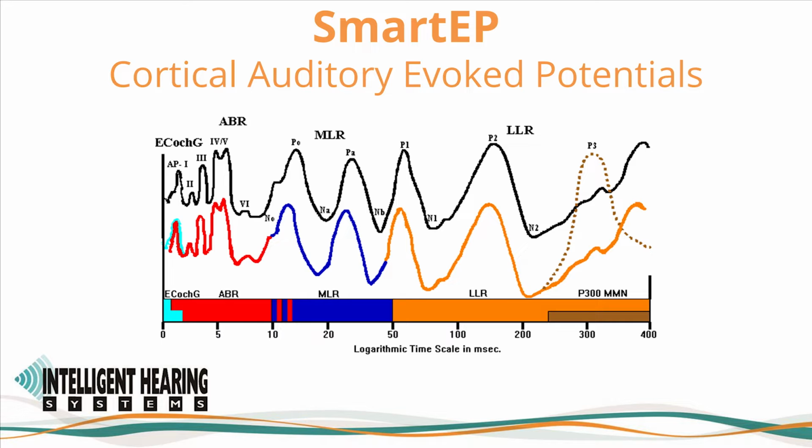Specifically, we will be reviewing the postsynaptic potentials middle latency response, or MLR, as well as a 40 Hz steady-state response typically used for threshold estimates. Then we will cover the late latency response modality, or LLR, and dive into options available in the SmartEP P300 MMN add-on module. Finally, we will review the generation of CAEPs using the Acoustic Change Stimuli Paradigm, which produces the Acoustic Change Complex.